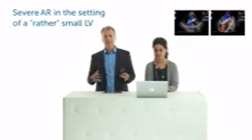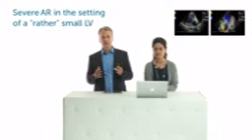Yes, it's acute AR, as we are seeing here in this example. With a massive regurgitant jet. And the difference to chronic AR is that in this case, the ventricle did not have time to adapt to this volume overload. And so the ventricle is still rather small. And, even relatively low amounts of aortic regurgitation can lead to massive symptoms, increase in filling pressures and dyspnea, and these patients can get into shock.